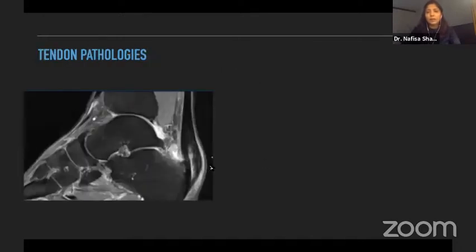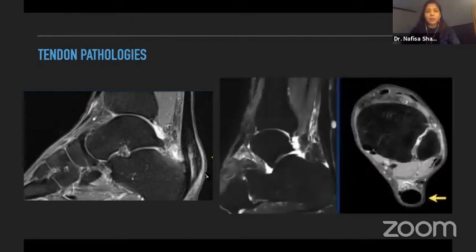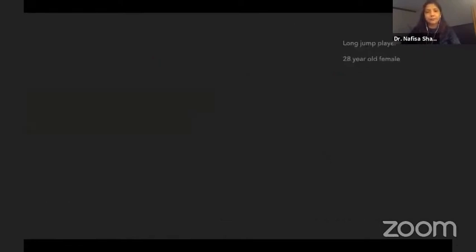Tendon pathologies. I think all of you know the Achilles tendon. Even though you can see this amazingly on ultrasound, and I think for most cases I would prefer an ultrasound, in such a case you could tell the surgeon where the tear is. Is it just interstitial? Is it complex? Is it oblique? Is it transverse? Is it just tendinosis, etc., etc.